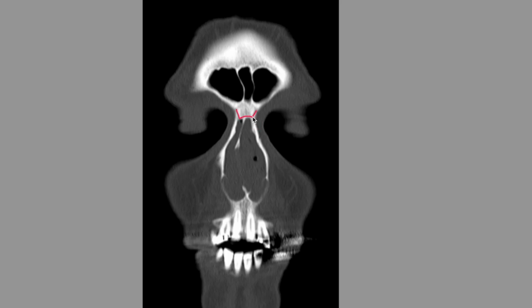So if you draw this out, these are the nasal bones in this coronal image. These are the maxilla, and then this is the frontal bone. Another thing to point out is this thin bony sheet within the nasal aperture. This is actually the upper part of the bony portion of the nasal septum, aka the upper part of the bony septum. Let me draw an arrow. The upper part of the bony septum is different from the nasal bones. In fact, it's part of the ethmoid bone.